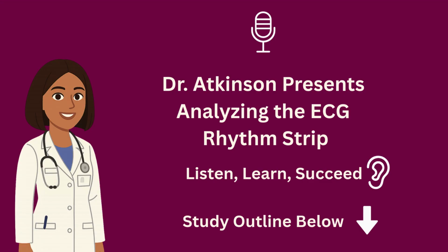Let's start with determining the heart rate. A 1-minute rhythm strip contains 300 large boxes and 1,500 small boxes. With a regular rhythm, the most accurate method is to count the number of small boxes between 2 R waves and divide 1,500 by that number. For example, if there are 10 small boxes between 2 R waves, the heart rate is 1,500 divided by 10, or 150 beats per minute. If there are 25 small boxes, the rate is 1,500 divided by 25, or 60 beats per minute. This method is precise and quick once you practice it.